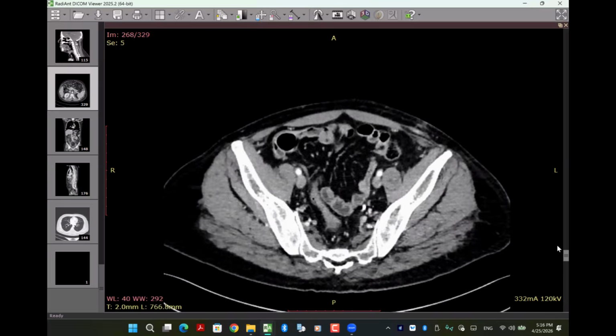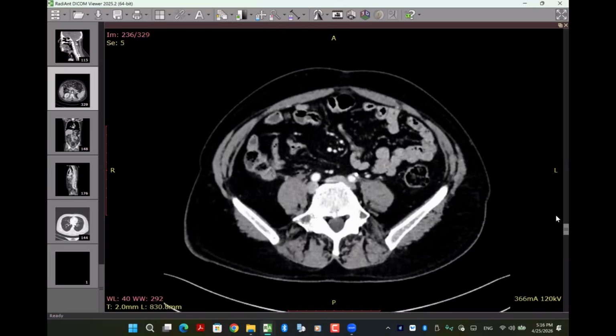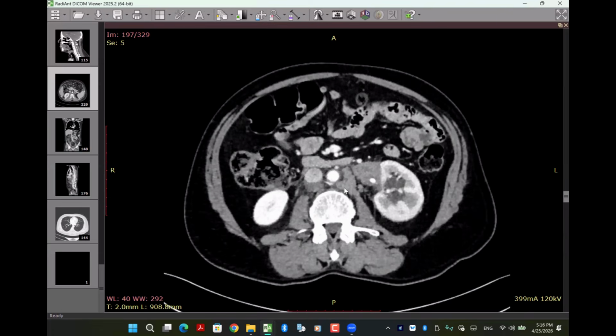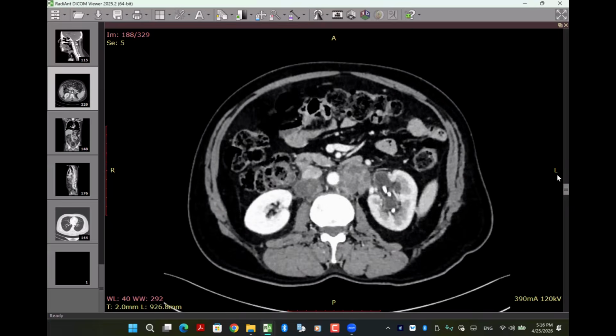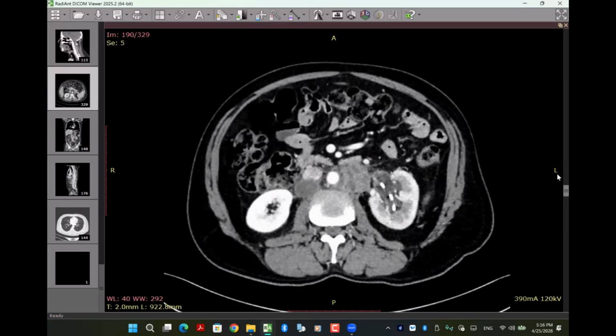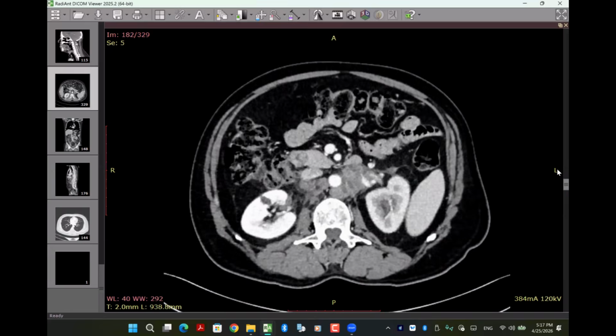Now you give me one diagnosis for this case and what you should inform the physician. This is multiple para-aortic metastatic adenopathy from a case of seminomatous tumor. Exactly?